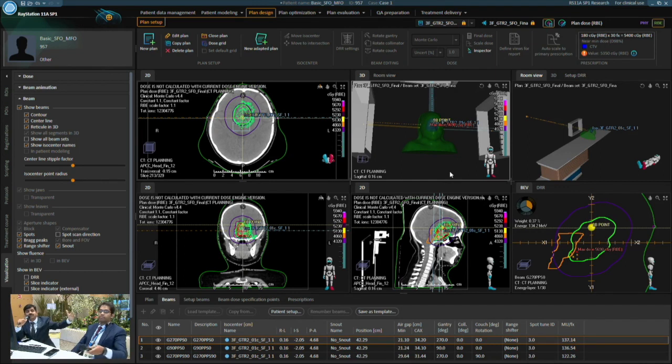So we covered the basic checks. Now let's take a pause, because we have about 7-8 minutes. If there are any questions, you can ask them. Any more questions regarding SFO, MFO?